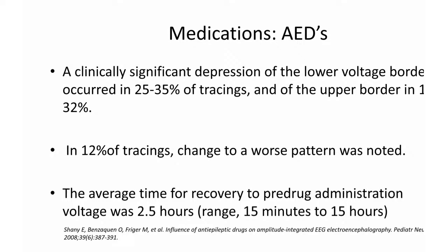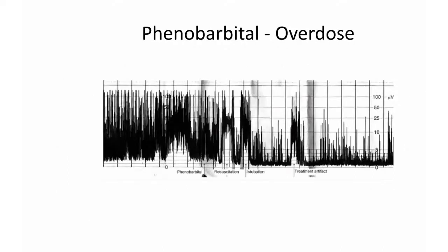Some really long, more like 15 hours. So I think it's just interesting to remember that these are going to be influences we see. This is another snapshot from another paper that Dr. Shawnee shared with us. And this was a baby who was having a seizure. So this right here, this uprising in the lower margin was demonstrated to be a seizure.